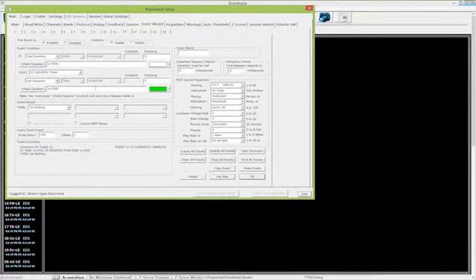It's a fancy way of doing it, but what's nice is if those numbers change and you still want to use that event, you don't have to change anything like that. What if I was actually looking at moving this over into that area? Well, if I was just putting those numbers, I'd have to change it to right here.